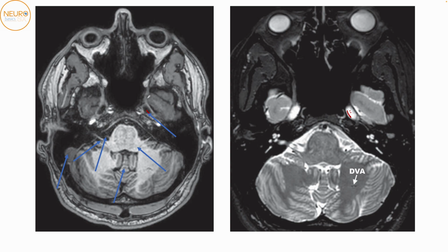Okay, at this level, the pons starts narrowing again and is starting to convert itself into the pontomedullary junction. That is why the connection between the cerebellum and the pons will start narrowing and becoming less bridge-like. So that's when you know it is turning into the medulla. This here is your 8th nerve entering the internal acoustic canal. This is the 7th nerve over here. This is the pons. Okay. This here is a cerebellar vermis. This is the sigmoid sinus over here.